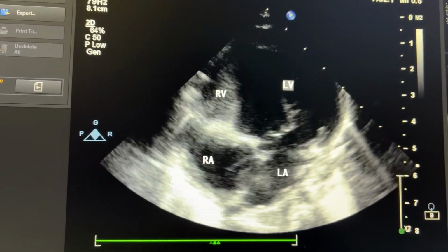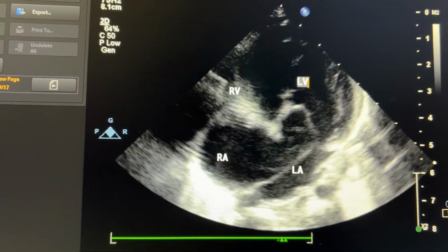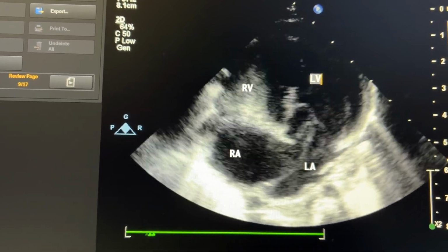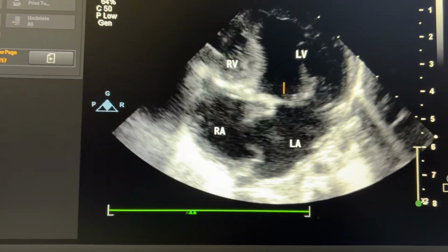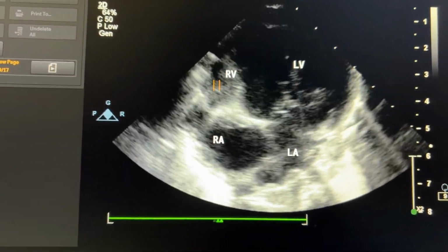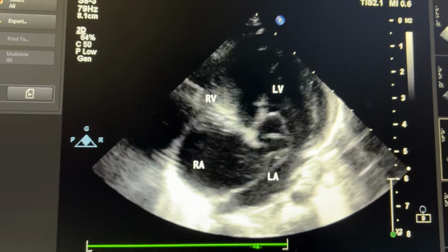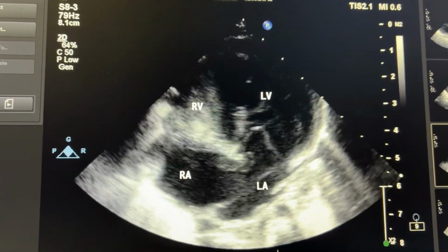Tricuspid valve atresia. Why? Because valve is not opening, at the same time valve is thickened, obviously fibrous, and so much shining. You can see the valve is shining. This valve is shining very much, indicating fibrosed. So this is the case of tricuspid valve atresia.